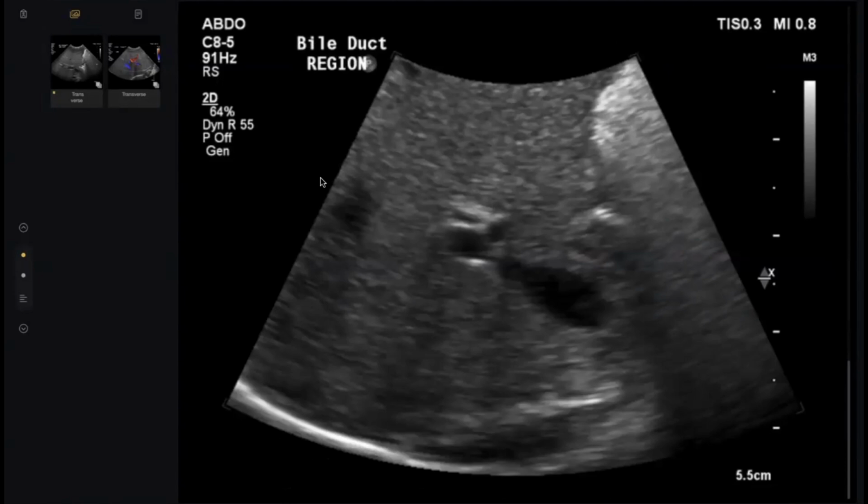And I want to see the biliary duct. What is this echogenic line? This echogenic line could represent the triangular cord sign of biliary atresia. Excellent. What is your next step? Next, I will convey the findings to the referring clinician and will advise nuclear scintigraphy HIDA scan for confirmation.